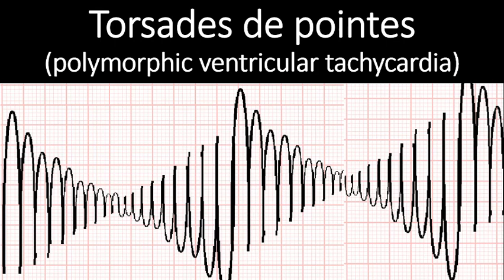But you can see on the left-hand side, you get these big curves at the top and points at the bottom, and it goes in this crescendo, decrescendo type rhythm, where you get decrescendo going down to this point on the left-hand side, then starting to build up, crescendoing up, and the points are now towards the top. It gets to a big point, starts decrescendoing down. You see points down at the bottom.